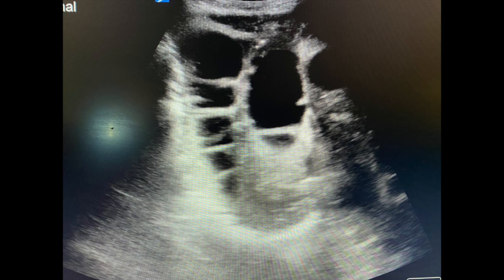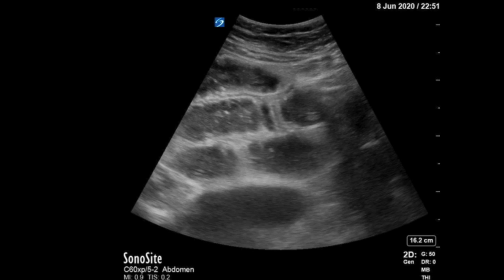The first thing you notice is that there is visible bowel and the bowel loops are distended. The cutoff point which is typically used is 2.5 centimeters dilated. And as you'll see in a couple of these pictures, it helps when they stack on top of each other in a fashion just like this.